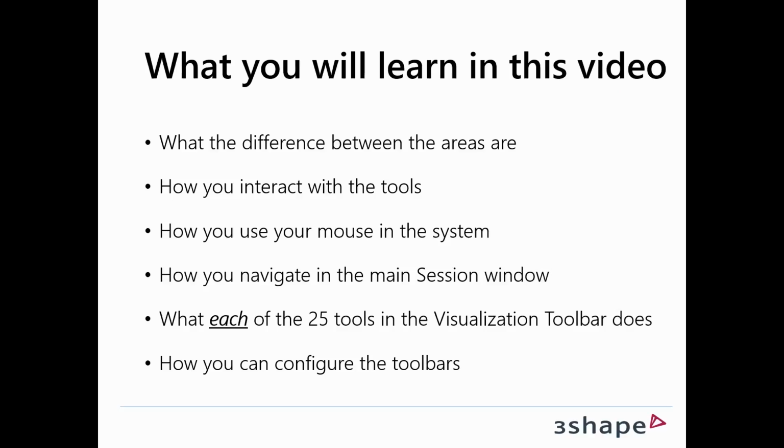So what you'll learn in this video is what the difference between the areas are, how you interact with the tools, how you use your mouse in the system, how you navigate the main session window, and what each of these 25 tools in the visualization toolbar are doing, and also how you can configure those toolbars. But let's go to Ortho Analyzer and see how it works.